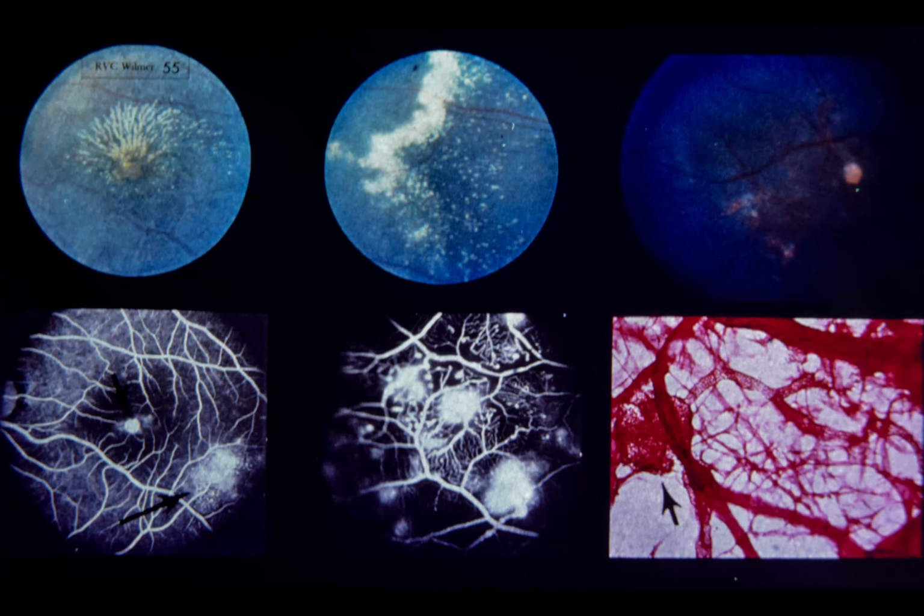Slide 55. Telangiectasis with peripheral and macular exudates. This 10-year-old black male recently complained of decreased vision in the left eye. Visual acuity was 20/16 right eye and 20/80 left eye. The right eye was entirely normal. Upper left, note star figure and fibroglial nodule in center of left macula. There is considerable lipid deposition throughout posterior pole as seen upper center.